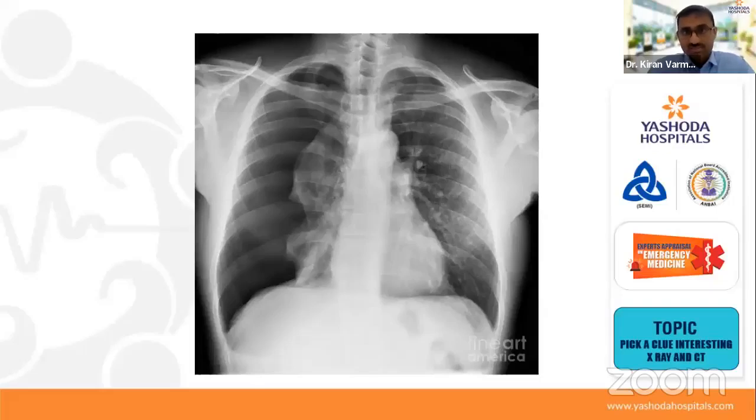We are not going to discuss that in detail. So in this X-ray, are you able to differentiate between normal lung and pneumothorax lung? One thing you have to remember here: bronchovascular markings. When there is absence of bronchovascular markings, then you can suspect pneumothorax.